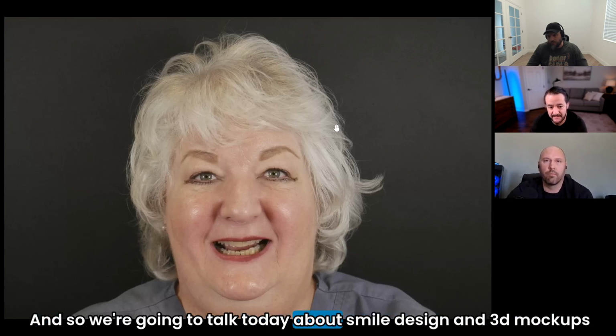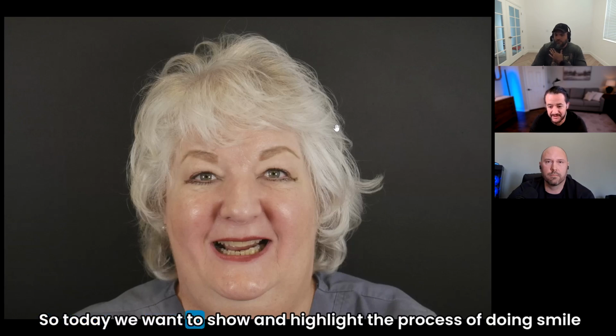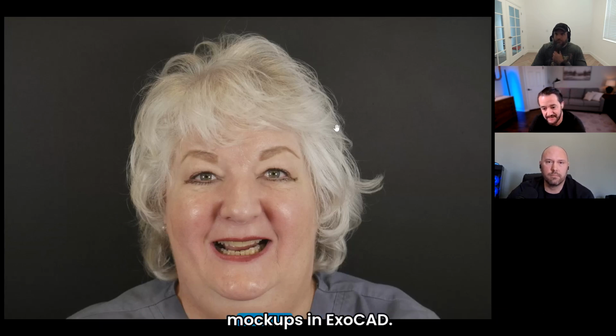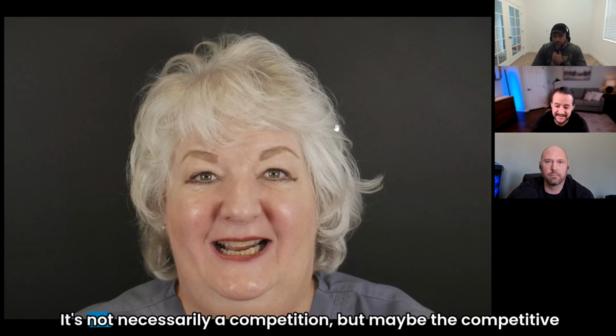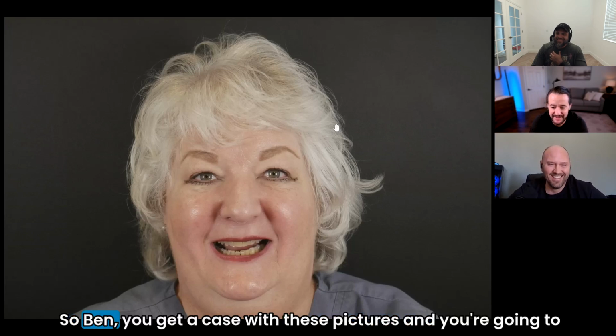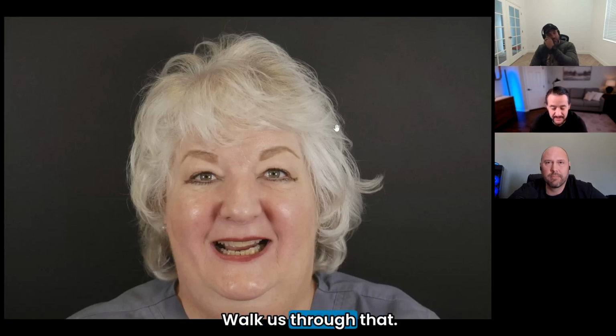And so we're going to talk today about smile design and 3D mockups and the value of that. And we're going to show that in both 3Shape and Exocad. So today we want to show and highlight the process of doing smile design and 3D mockups in 3Shape, and also smile design and 3D mockups in Exocad. It's not necessarily a competition, but maybe the competitive spirit will be unavoidable. So Ben, you get a case with these pictures and you're going to begin a 3Shape smile design. Walk us through that.